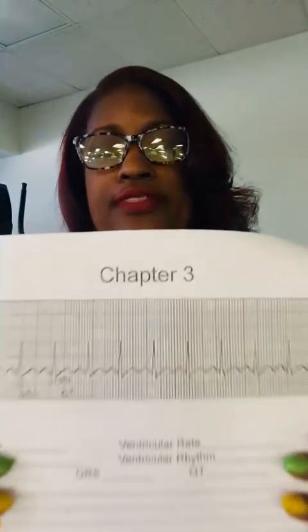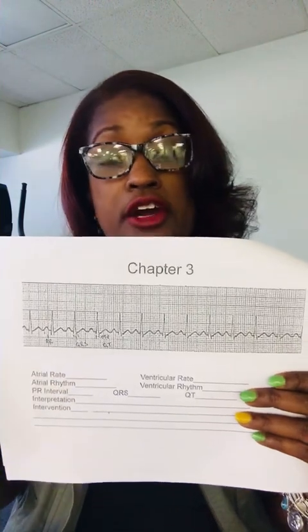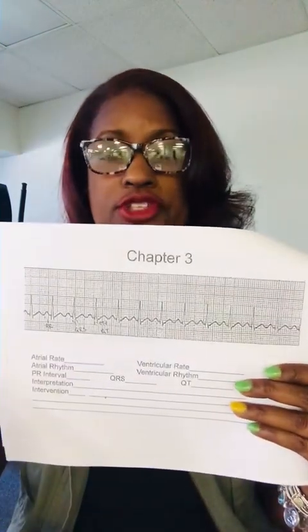Okay, let's get started. If I have my glasses on, it's time for a handout. So let's remember what we discussed earlier. We said that on NCLEX, you're basically dealing with a 6-second strip. We also said that when it comes to figuring out the rate, we just have to count the R's. And so we started with literally looking at this strip.